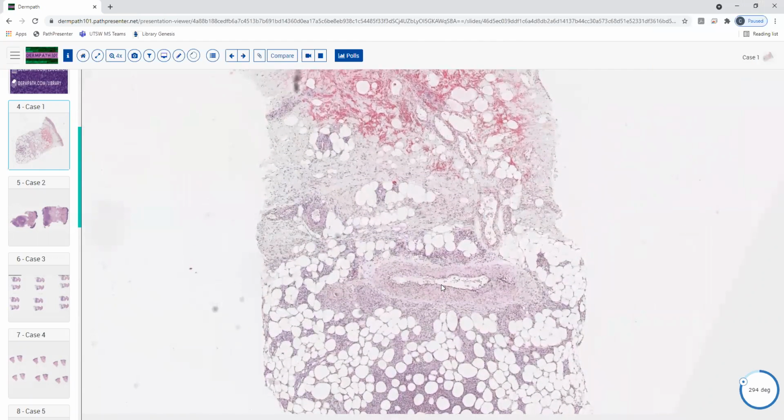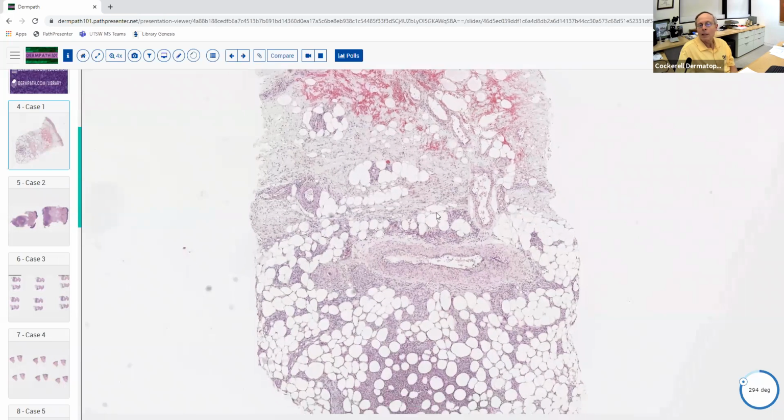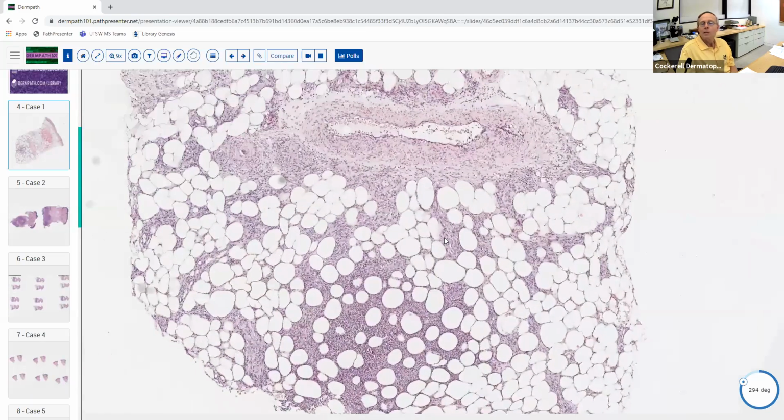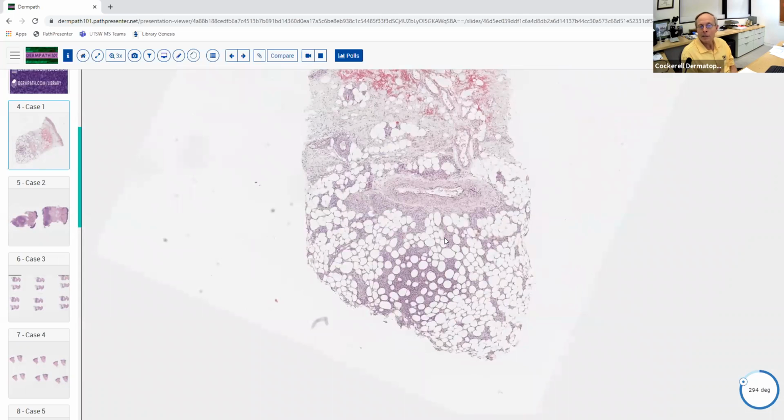Yeah, so putting together the vasculitis with the lobular panniculitis leads me more towards erythema induratum, as opposed to others on the differential for a lobular panniculitis. Good, excellent. That's exactly right. So what other items are on the differential diagnosis of a lobular panniculitis? You don't have to go through all of them, but what are a few others that, when you first say lobular panniculitis at low power, instantly pop into your mind that you want to start excluding?